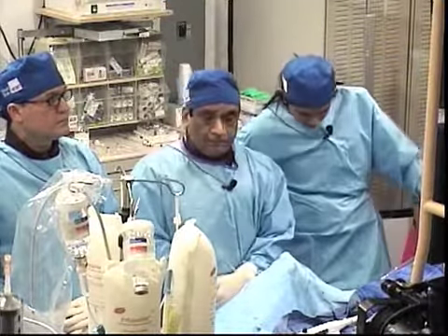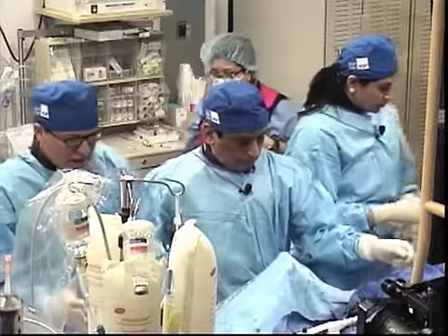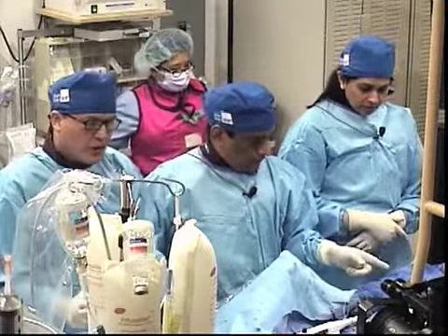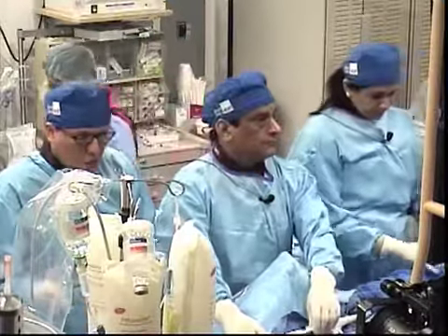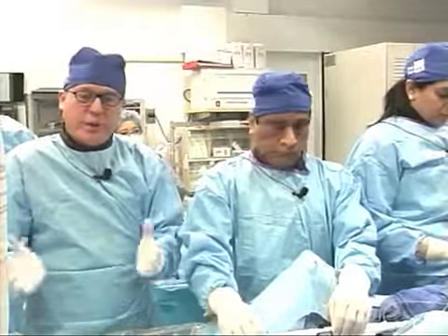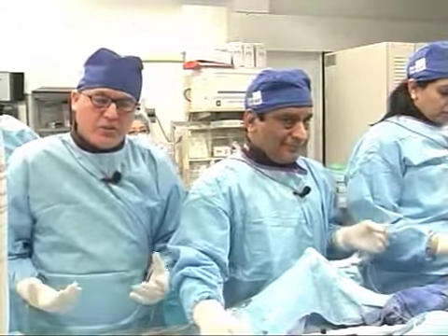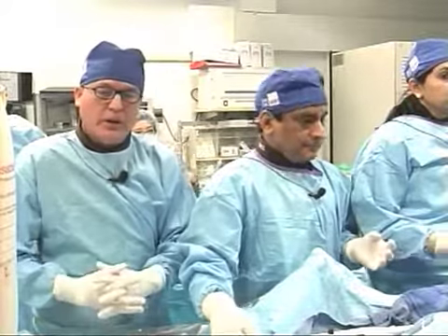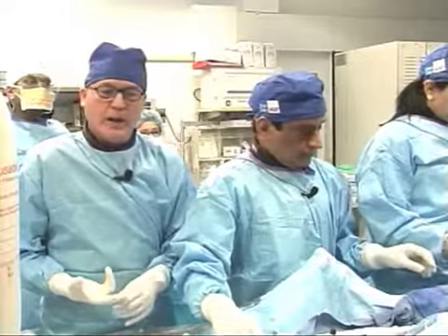Pedro, very, very nice and quick review. So one of the absolute practical benefits would be where you want to interrupt dual antiplatelet therapy? That's a very good point. It's clinical information that you can obtain to reassure you. In case you're doing a case and you want to see the stent, proximal LAD, bifurcation stenting, you can image it. If it is properly endothelialized, you have peace of mind in case you want to stop the dual antiplatelet therapy. However, this needs, of course, randomized prospective data to be absolutely evidence-based.